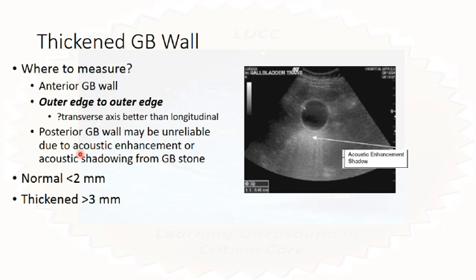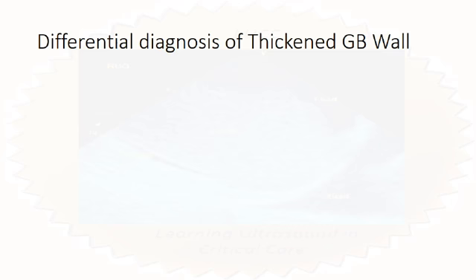So automatically, what struck me was, how small is that margin of error? It is very, very easy for you to manufacture a thickening of the gallbladder where there is none. Therefore, it's a soft sign. I don't think you should put much emphasis on this unless the gallbladder wall is really, really thick. But even then, there are other causes for the thickened gallbladder wall.